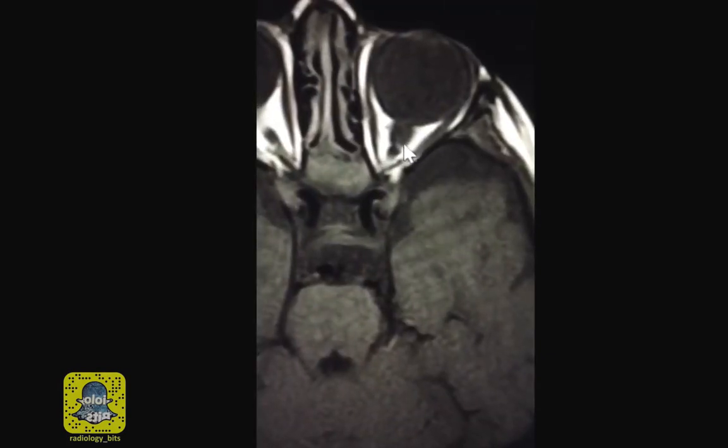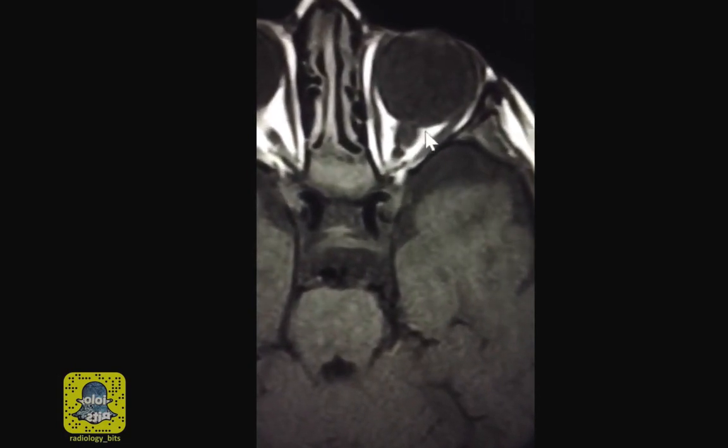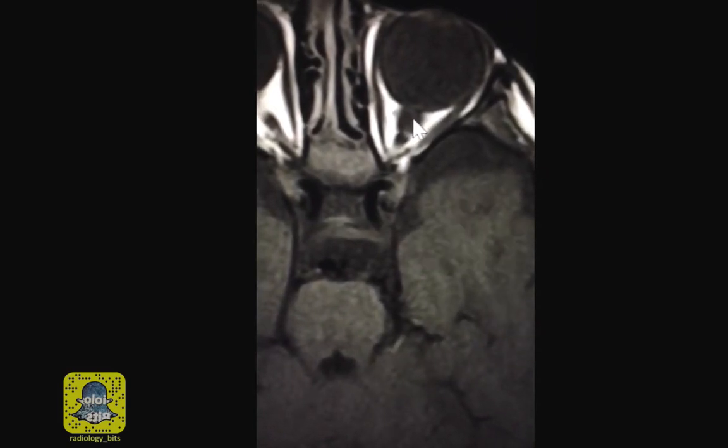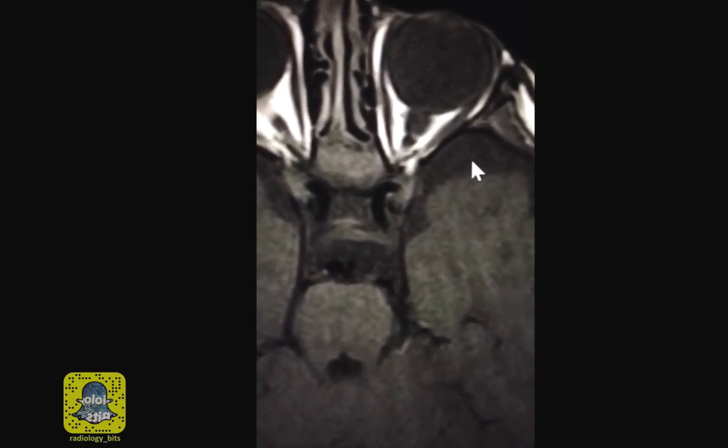And this tells you that this could be fluid. And to confirm that this is fluid, let's look at it on a T1 axial image where there's no fat saturation, so the fat is bright. And as you see here, the area that we suspected as being cystic or fluid dilatation is equal in density to the CSF, so it is fluid.